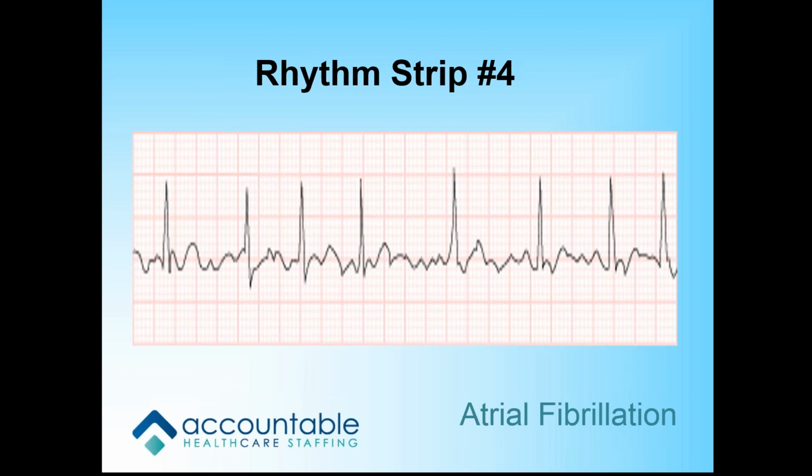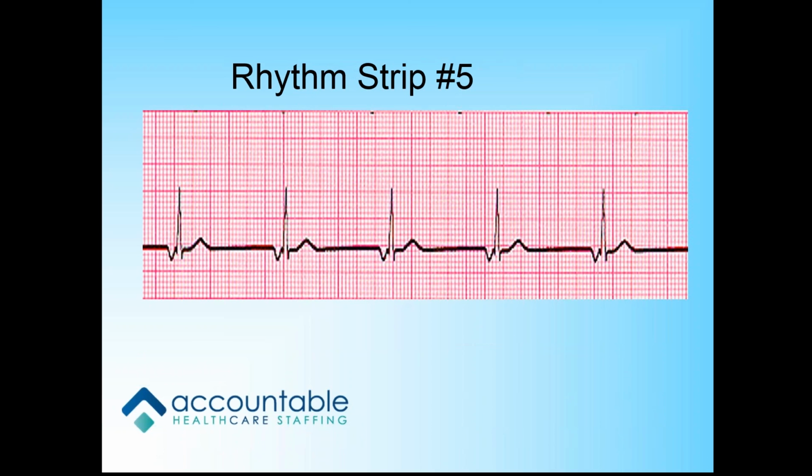You're welcome. Jess? Okay, I called your name before I looked at the rhythm that was up here. That's okay. But we'll use all of the steps in rhythm interpretation.